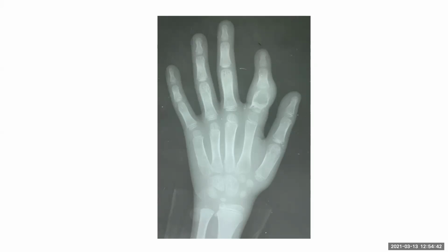And the other striking abnormality is that the length of the index finger is also short as compared to the other fingers. Apart from this, I cannot clearly appreciate any other abnormality in other fingers.